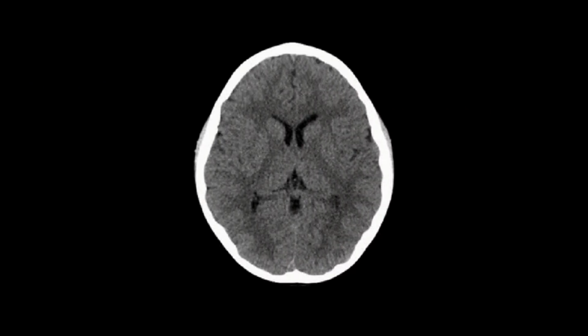Right, so the last of the gray matter structures we're going to look at are the basal ganglia and the thalamus. I always use the lateral ventricles to identify these structures because they're right up against it. As we saw earlier, this is the lateral ventricle, one on either side. If you notice closely, we have all this subcortical white matter which was less dense, right? So we already saw that. All through that you have radiating fibers, but this particular portion is sandwiched between the lateral ventricle and the subcortical white matter. If I clear all that, you can have a better look.